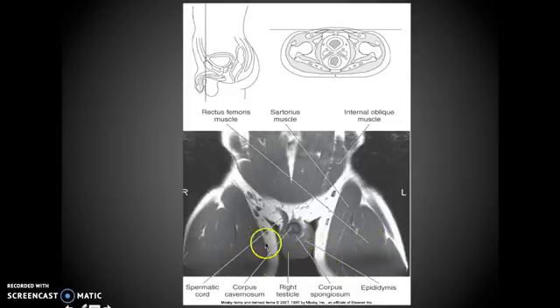This is a male, as you can see the package here, but the epididymis is here, and this is the left and the right testes. You have your corpus cavernosum, and you have your corpus spongiosum down below. So these two are the corpus cavernosum, and then your corpus spongiosum is down below. This right here is your spermatic cord, and then you can see lymph nodes within.